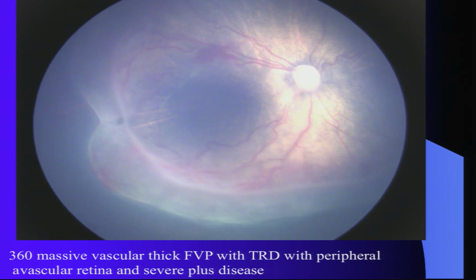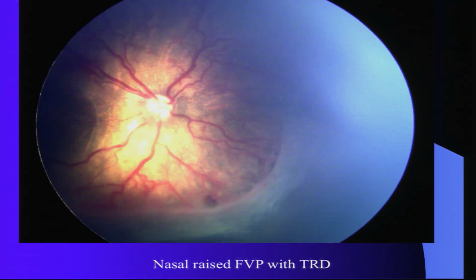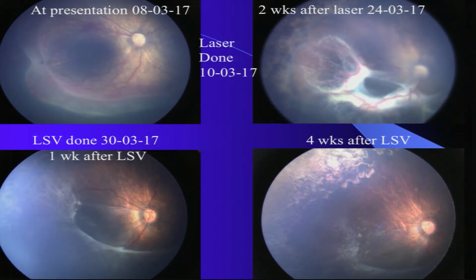This case came to us last year, 360-degree massive, thick disease, and that is the way you can demonstrate. You see, even look at the nasal side. It is looking so serious, and it is. The problem is, it came late from outside. We did confluent laser as much as we could. Now, I'm going to ask you, would anybody have injected here in such a situation? Perhaps nobody. It would have contracted and produced a total crunch. So we did laser. It became like this.